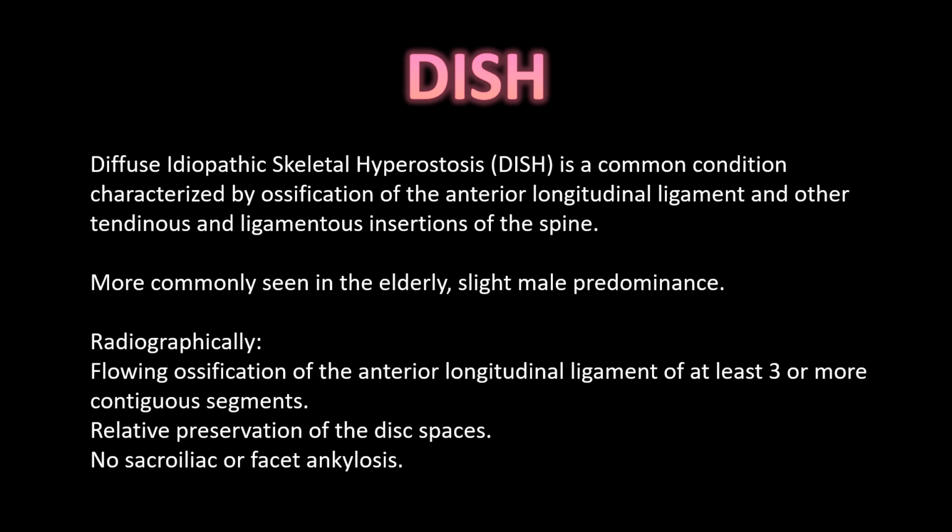And this is a very common condition characterized by ossification of the ALL and other tendinous and ligamentous insertions all around the spine. It's most commonly seen in the elderly, usually with a slightly male predominance. Patients with diabetes are also associated with DISH.